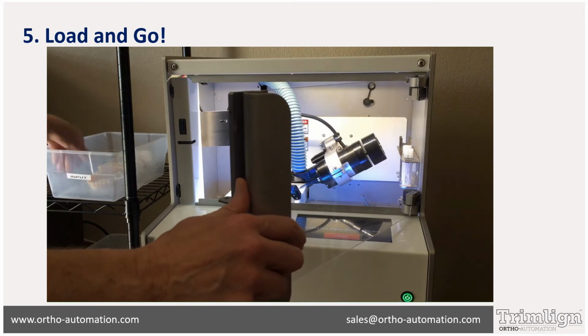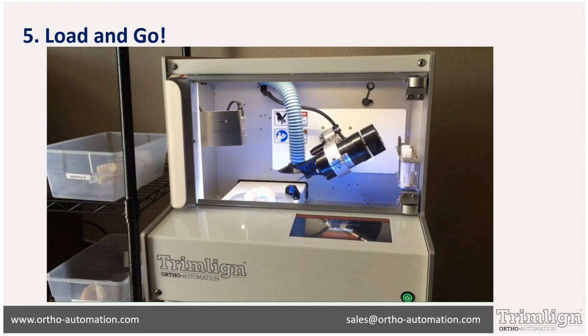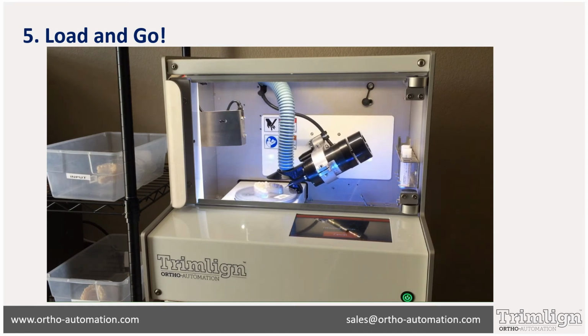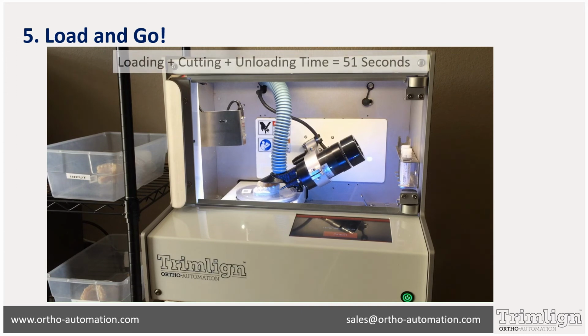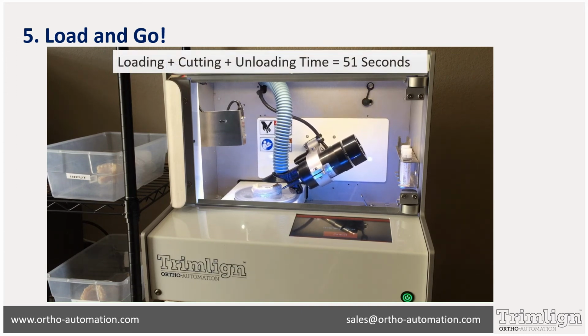What was the most tedious part of the aligner manufacturing process is now the easiest. Simply load the aligners one after the other into the Trimlign machine. The barcode is read to identify the aligner and trimming starts automatically. Trimlign precisely executes the trimming path generated by 3Shape. Trimming takes approximately 51 seconds per aligner, including the loading and unloading process.